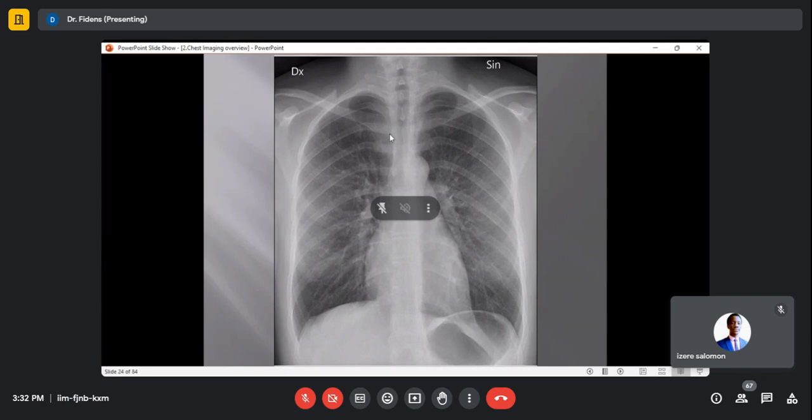I would like you to show, but the medial end of the clavicle here. Can you see? The distance from here to the spinous process, they make a vertical line. Can you see the line? The distance from the line made by the spinous processes to here is almost the same as from here to there. So not by millimeters, but almost the same. Meaning there was no rotation.